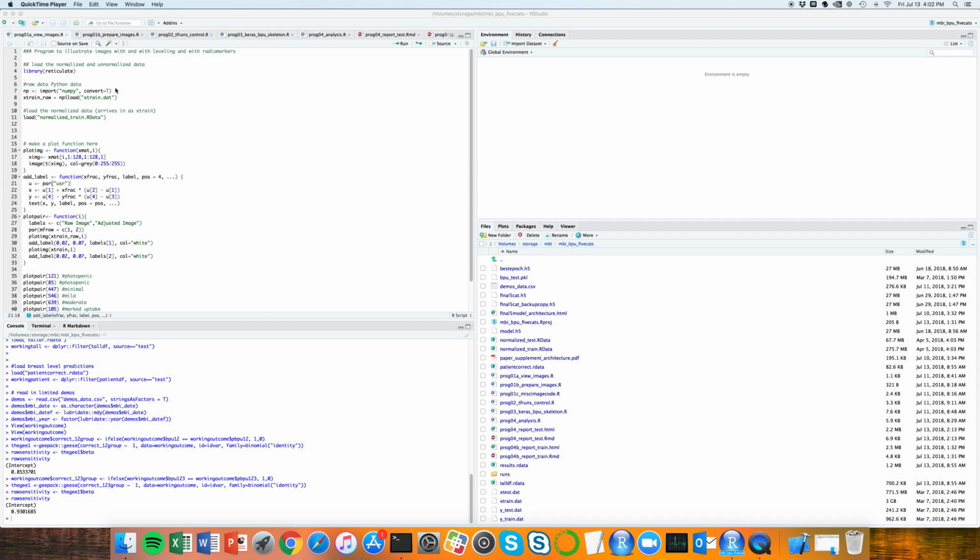All right, good afternoon. I wanted to walk through a program for a paper I'm looking to publish and give a little bit of idea about the coding complexity and how we can use reproducible research strategies for deep learning. So to start, I'm going to open up a couple different things. I'll show what the data looks like.